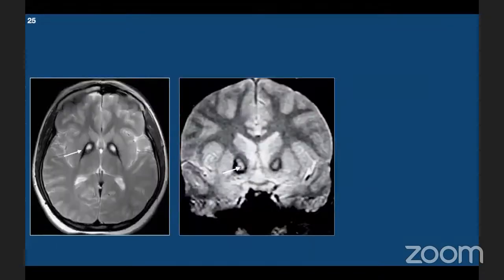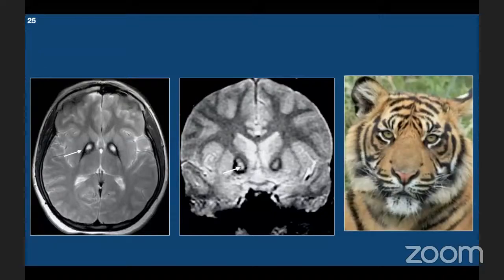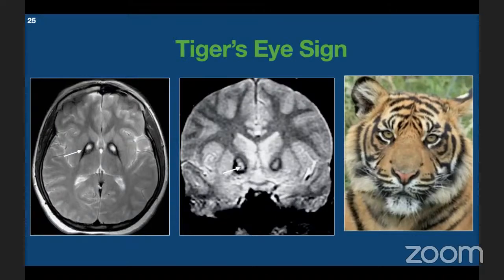This patient is showing bilateral symmetric high signal inside globus pallidus. It is surrounded by increased iron-containing brain tissue. The central high signal is due to gliosis, increased water content, and neuronal loss. This particular image resembles eye of a tiger and known as eye of the tiger sign.